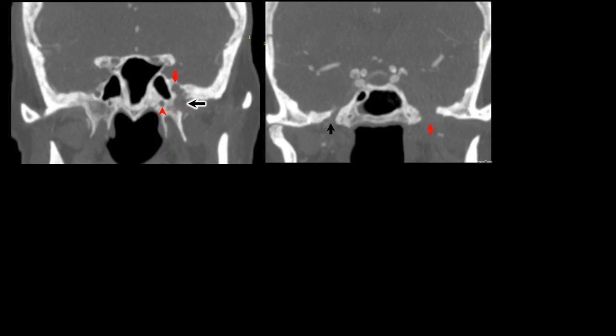The last subject I would like to briefly touch on is the numerous skull base foramina that extend through the sphenoid. Remember that you can have pathology affecting the skull base foramina of the sphenoid. Notice in this example that there is abnormal enlargement of the left Vidian canal and the left foramen rotundum, with erosive changes involving the left pterygoid process. Additionally, the ipsilateral left foramen ovale is markedly widened.